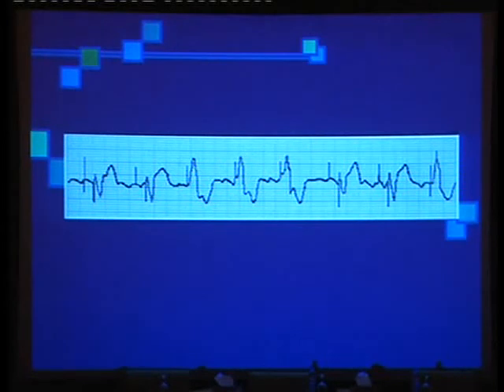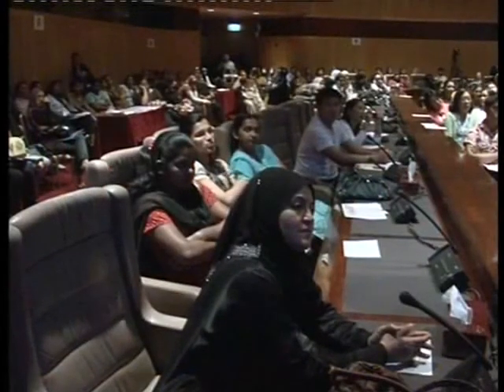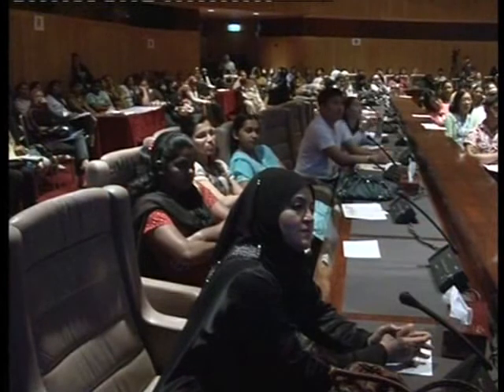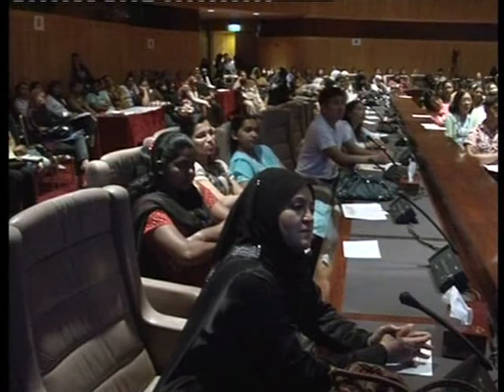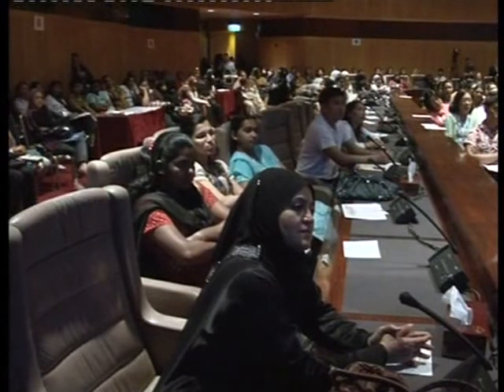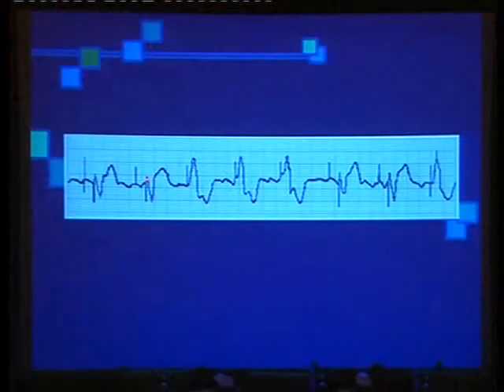I will give you the tracing. This is an ECG. So I wonder what your interpretation is. This is V1, by the way. So you see here the dual chamber upgrade. You see one spike coming, this QRS depolarization, one spike here, and we have the depolarization here also, and we have another morphology here. So what is going on here? This is atrial lead dislodgement.